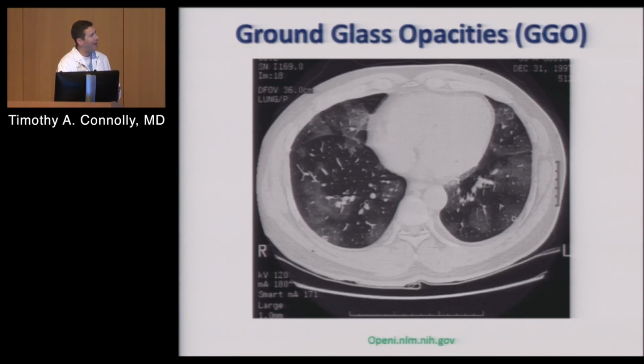So this ground glass opacity, everybody reads it and freaks out on a CT scan. It usually just means they're a little bit fluid overloaded. So don't build it up to be anything more dramatic. That's all it is.